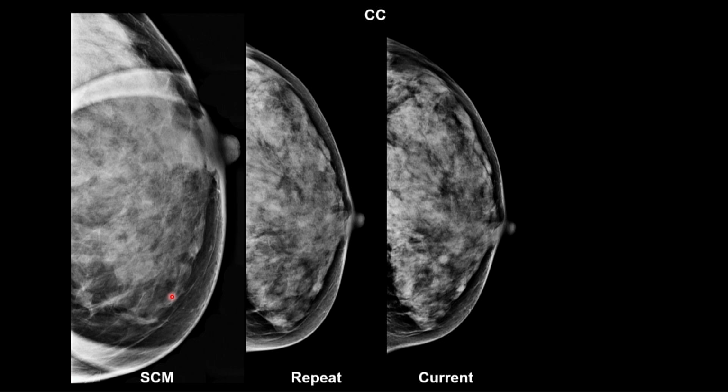Because we didn't work it up. If we had worked it up, I would have mentioned it. So, I don't know. I can go back to it, but you're going to have to try to explain to me where this finding is. Let's see. I want to hit this button here.